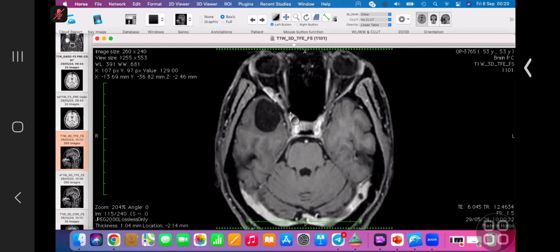This rules out meningioma and also rules out glomus tumor. Glomus tumor here at this point? No, it's ruled out. Intraocular. Yeah, unlikely.